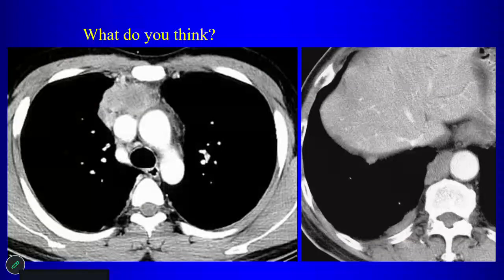It's like a pleural metastasis. Yeah, so you have these pleural lesions, right? So these are drop pleural metastases. So if you see these in combination with an anterior mediastinal mass, the first thing on our list becomes invasive thymoma, right. So this is a malignant thymoma. This is invasive thymoma.